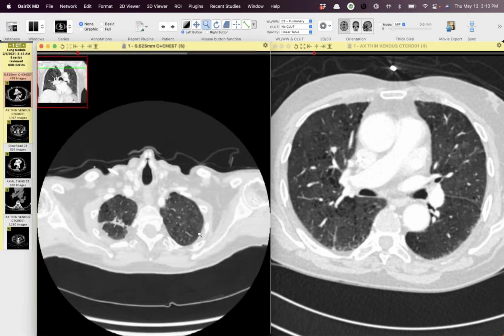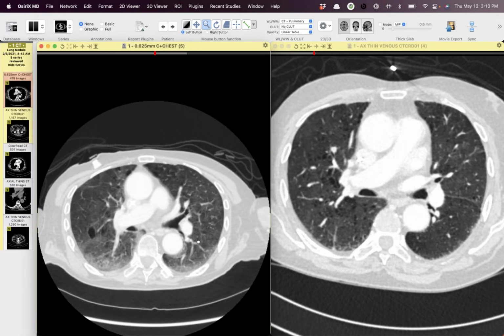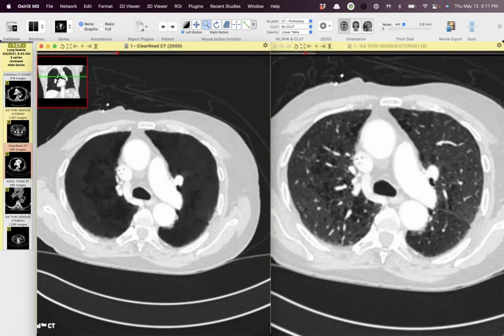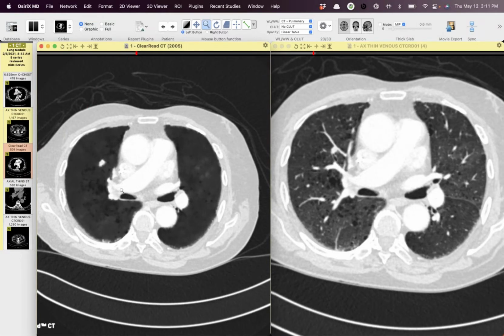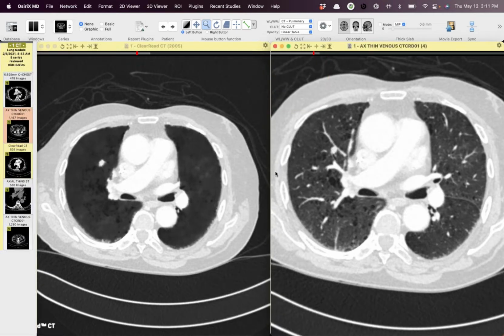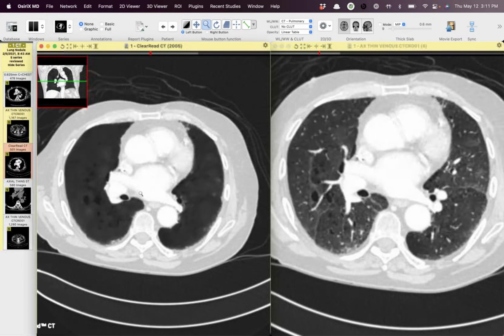But there's a nodule hiding on this image that on a prior study from a few months ago was not present, or was a couple millimeters smaller. I'll let people look and see if they see it. We know blind spots are centrally and along vessels, but I'll show you the vessel suppression. If you haven't seen this before, it's a product that will subtract out the airways and vessels, and sometimes it leaves you artifacts. A lot of times stuff that's central is actually still vessel that doesn't get subtracted. But sure enough, right here you can see that nodule really shows up and was not seen on this study.